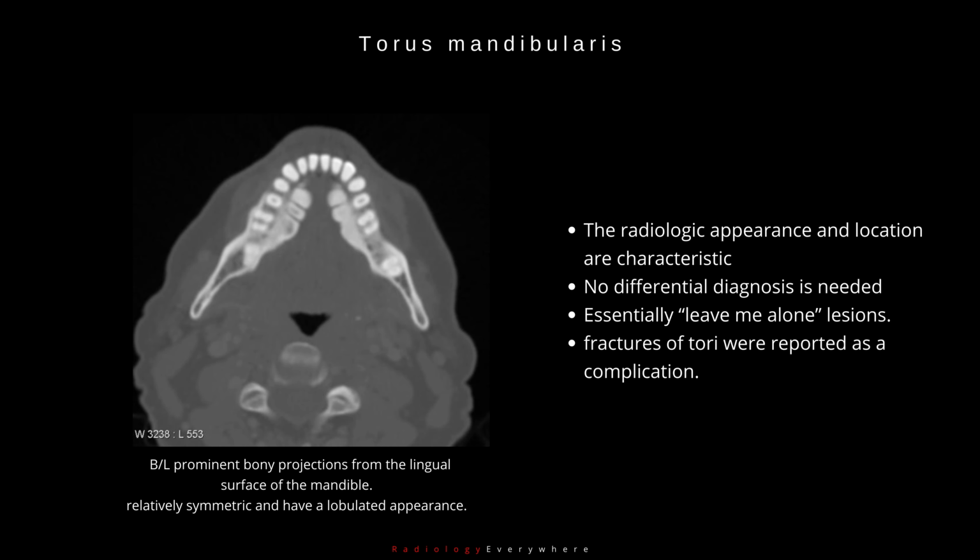The radiologic appearance and location are characteristic. No differential diagnosis is needed. These are essentially leave-me-alone lesions. Fractures of tori were reported as a complication.